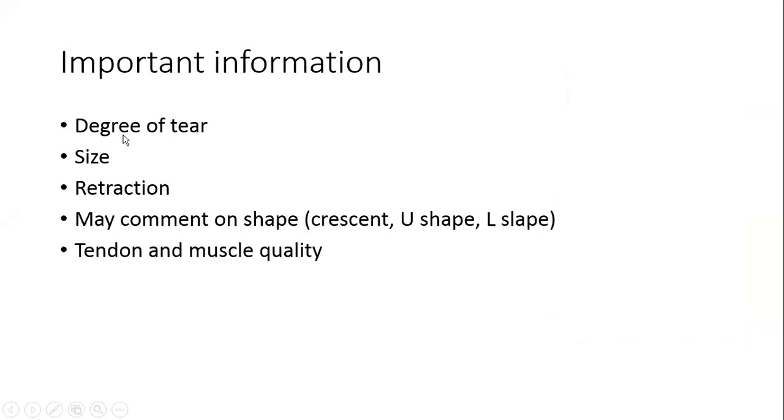If there's no tear, then you say, okay, it's a normal tendon, no focal tear or any focal defects. Then there may be some other problem, maybe bursitis, tenosynovitis, or maybe a joint pathology, not so much of tendon. But if there is tendon pathology and one of the tendons of the rotator cuff is involved, you have to define what's the degree of tear.